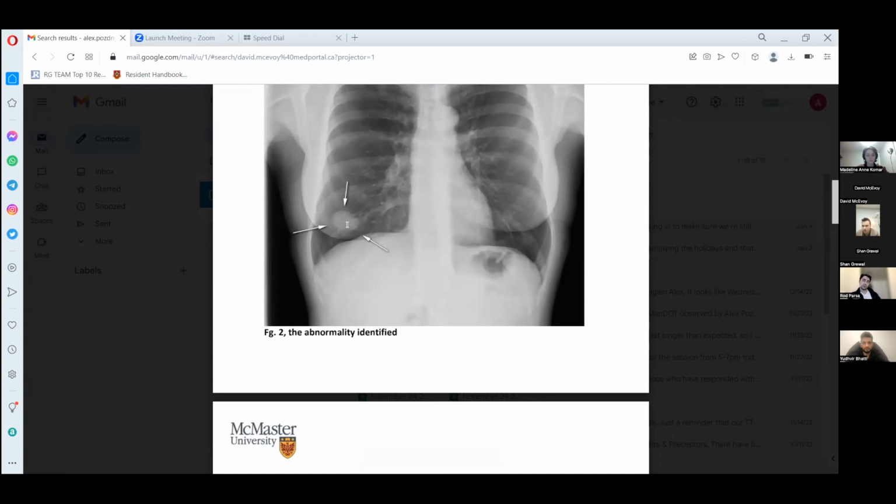So at this stage, of course, it's very early, and I think thinking in broad categories is always great. So I like how you thought about neoplastic causes, cancer. Of course, it's still very difficult to say what exact type of cancer it is, and it's not really the point of the chest radiograph. It's more just to alert you and to prompt more investigations down the line.